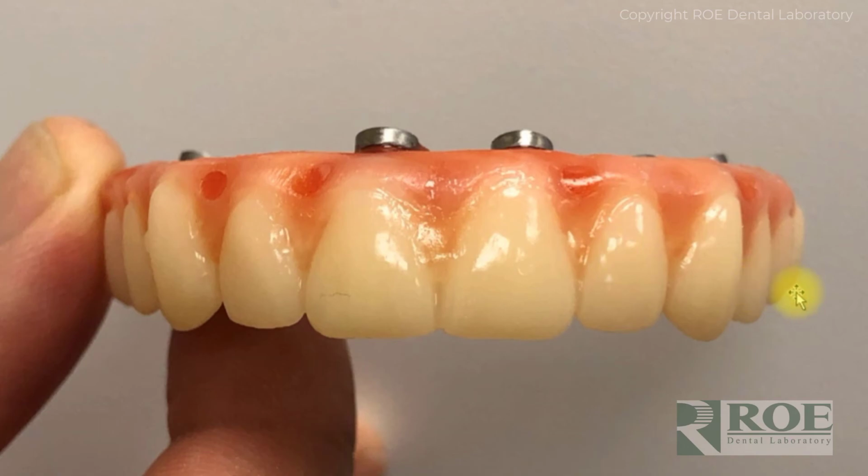And so if a patient hits early in the posterior, floating the prosthetic and tipping the anterior down is not really the right thing to do. The better thing to do is do a minor equilibration and have the patient come back in a day or two, and the patient will naturally go back into the proper bite more often than not. So just a little caution about using these ports for that reason.